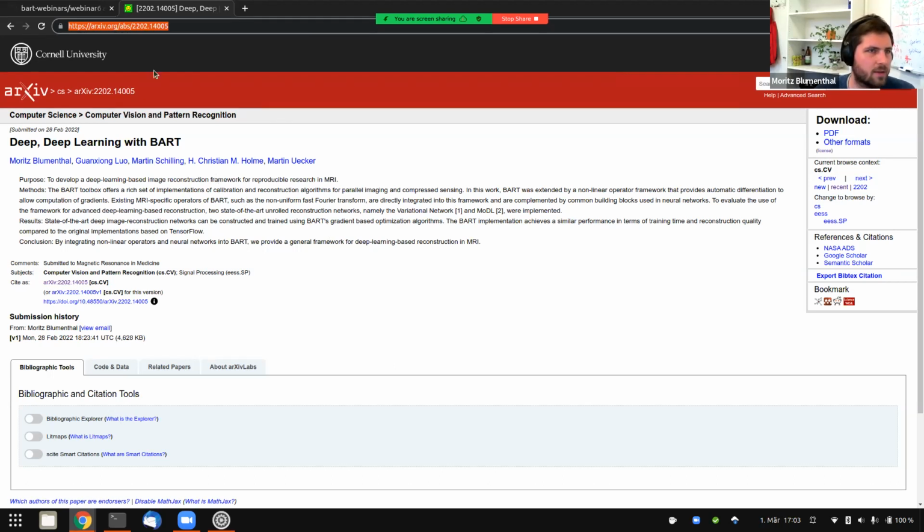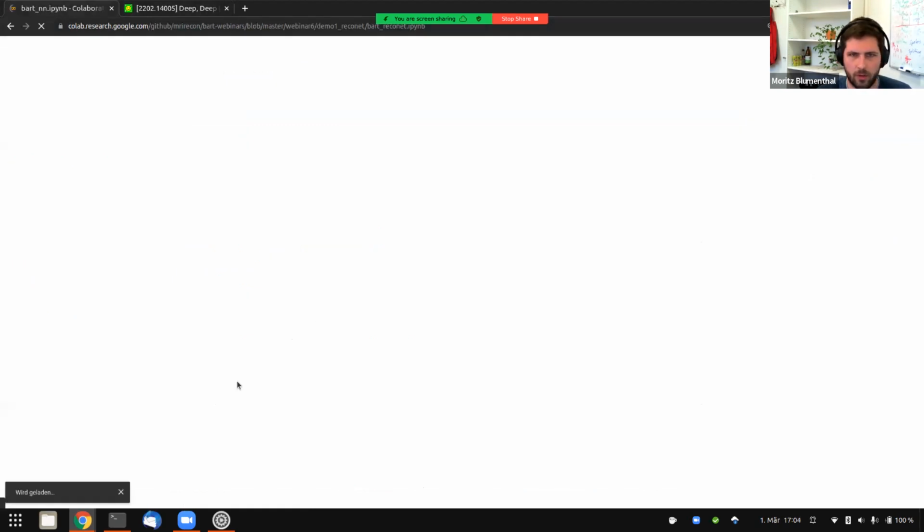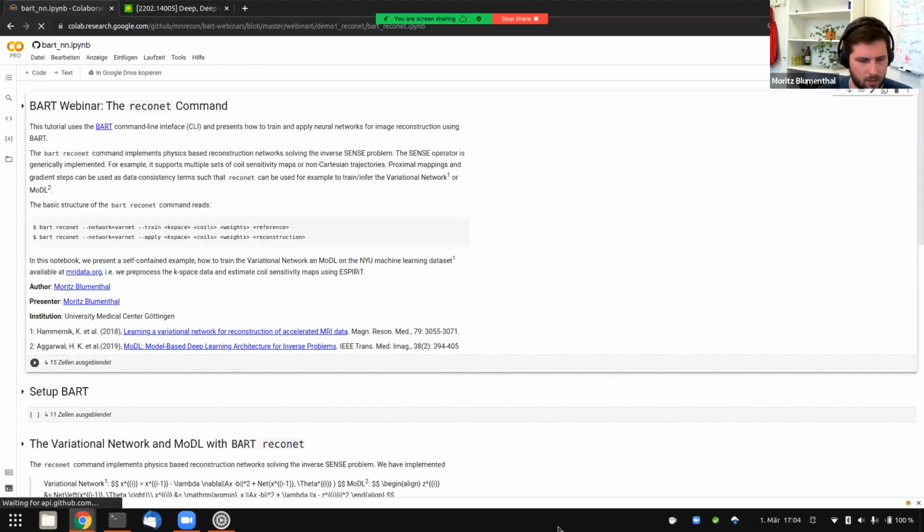We will also update the Jupyter Notebook to include that link. But now let's start with our demonstration of the BART reconet command. So I assume you can start from this webinar GitHub landing page, and then we can just do open in Colab to start with the tutorial. And let's go to full screen mode.